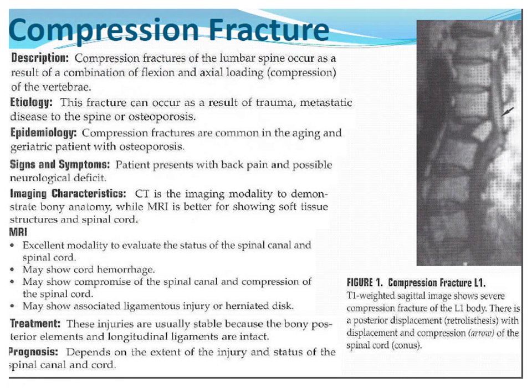Here's a compression fracture. This seems kind of similar to a burst fracture, but these can often happen with very minimal trauma or no trauma at all. Usually they're associated with osteoporosis in older patients. If you've ever seen an older patient where all these vertebral bodies are wedged like this, then you know that they've had many compression fractures. Sometimes they go unnoticed and undiagnosed at the time of the actual fracture.